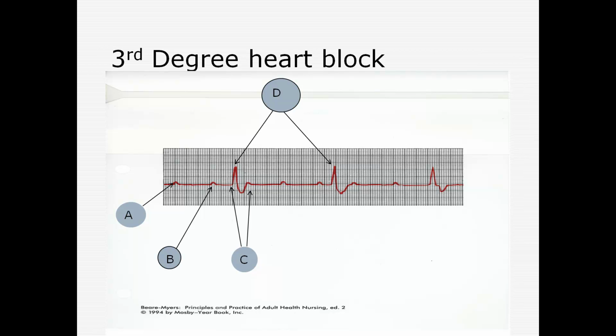This can be a lethal rhythm. People can be awake with this, but we better get a pacemaker in them. If you lived way out in the country, and you're riding your horse in the Hawaii mountains, and you had this happen, and you fainted and no one to find you, well, you don't have enough perfusion here.